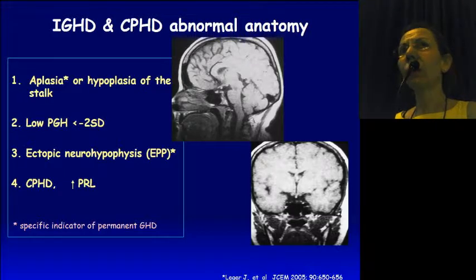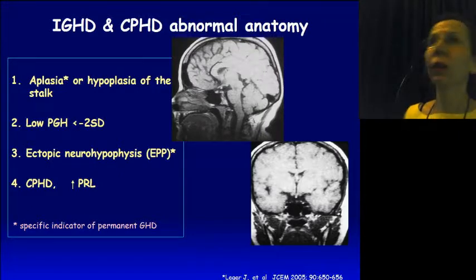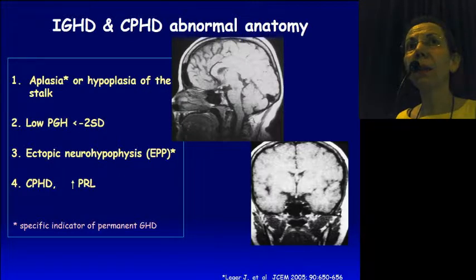And this was the very first description, and this term erroneously remains for different cases. So let's start from the real pituitary stalk interruption. What we see on imaging in those cases: you see a small pituitary gland, orthotopic in the sella turcica. You don't see the bright signal intensity in the sella turcica, which is the neurohypophysis. Of course, those babies are well hydrated.